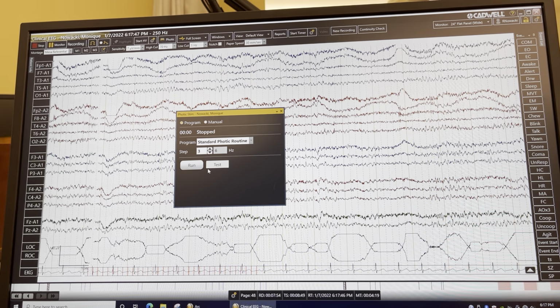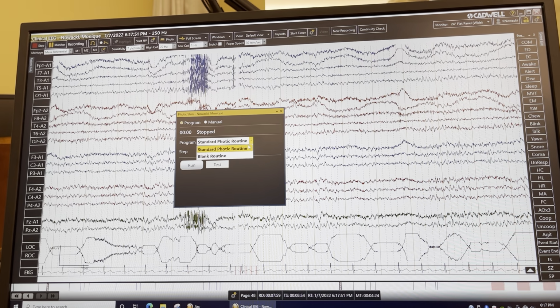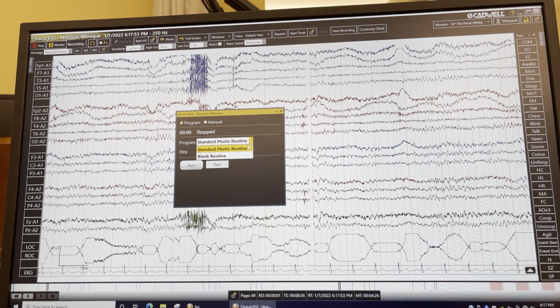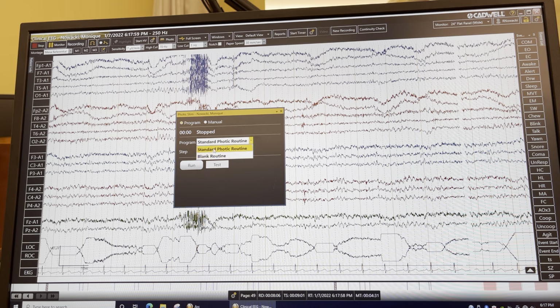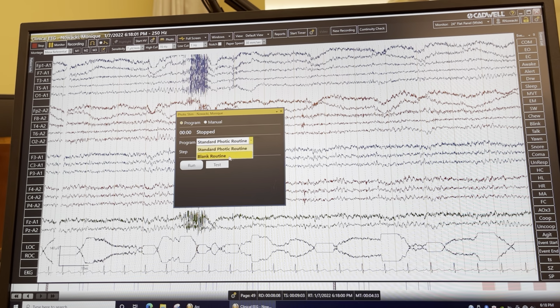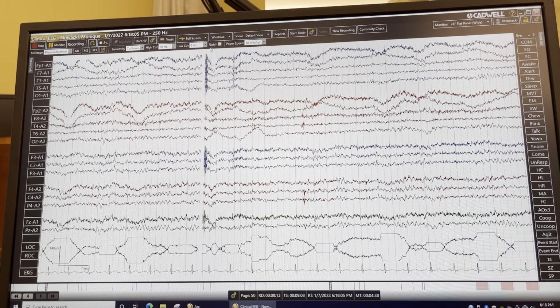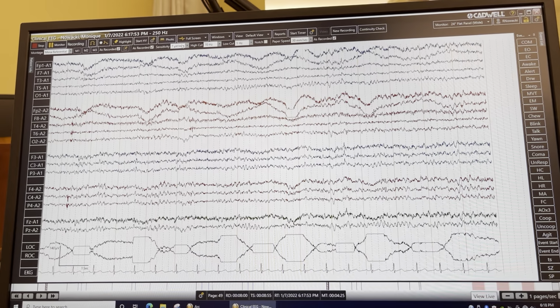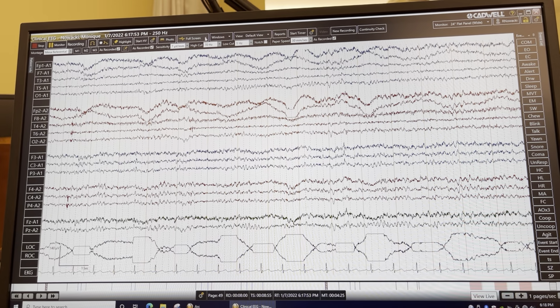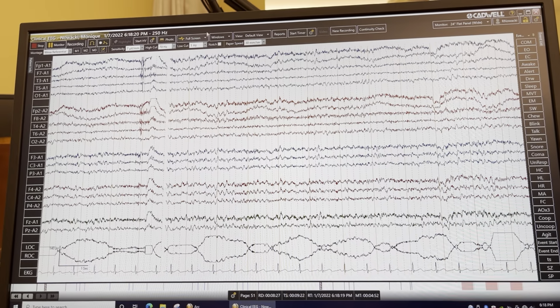We're gonna stop it. But all you have to do at your clinicals is just ask them which protocol they use, or you're gonna be observing, right? So you can just figure that out and put it in your notes. All right, and then this one here, that's for if you want to do a review mode. Oops, review live. Okay, so there's a couple of ways you can go into review mode.